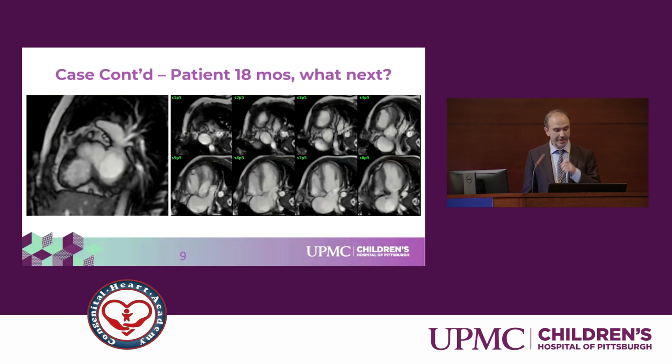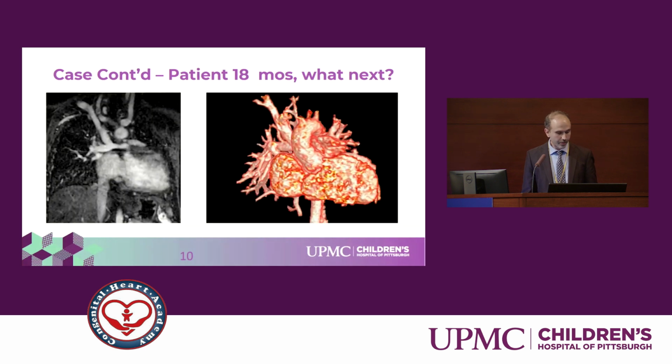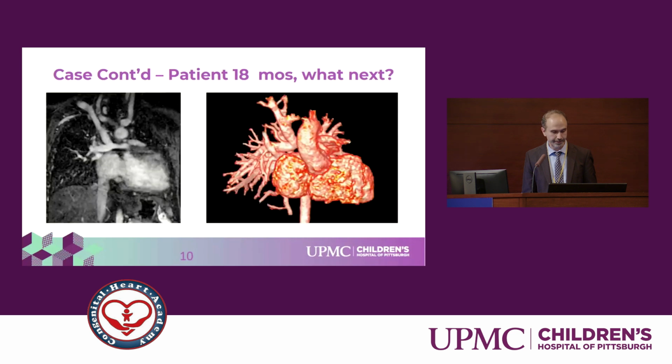And you can see we did a cardiac MRI on her. You can see on this cardiac MRI that her right ventricle is decompressed here. You can see that there are some tricuspid valve leaflets here. And then this is an apical stack, and you can see that the right ventricle has decompressed, and there is a fenestration in the Starnes membrane.